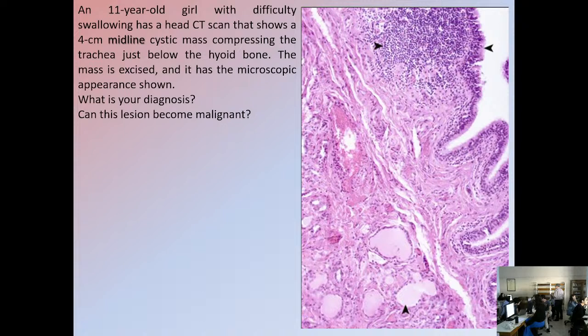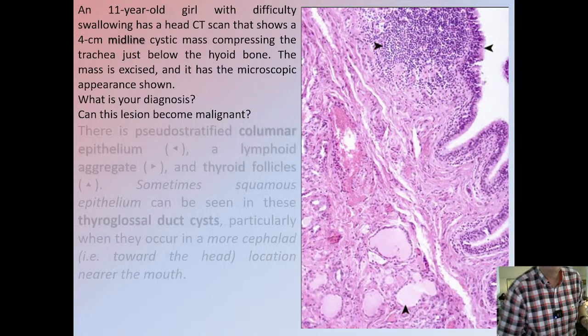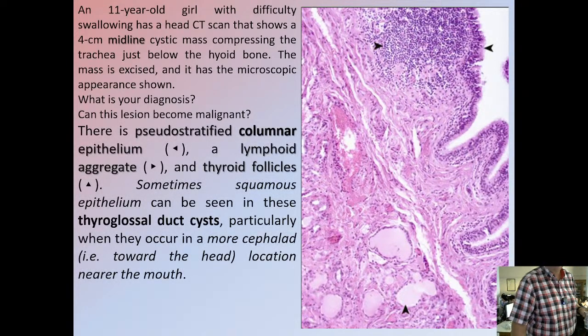It's simple. A simple epithelium forming, yes, follicles. Like you can say glands. It won't be wrong. But this configuration, taking into account the anatomical location of the lesion, which organ makes you think? Thyroid. The thyroid. This appears to be thyroid follicles. So you see glands having this colloid content, and you are close to the midline. So it's most probably thyroid tissue. So this helps us make the diagnosis of a thyroglossal duct cyst.